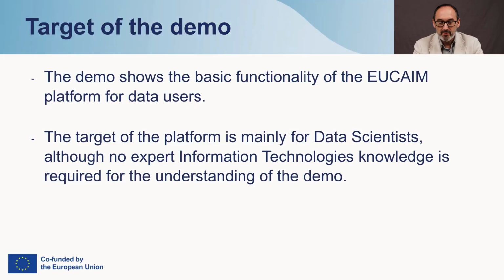In this demonstration that I am going to show now, it shows the basic functionality of the EUCAIM platform, mainly for data users. The target of the platform and of the demonstration is mainly data scientists who use the data to develop their own tools, develop AI models, and the rest. However, we will not require any ICT knowledge for understanding the demonstration.